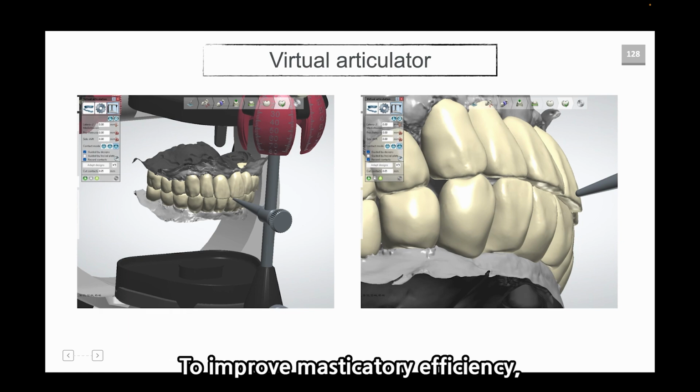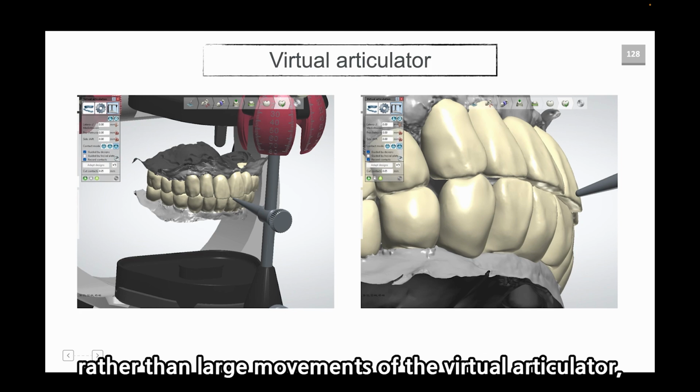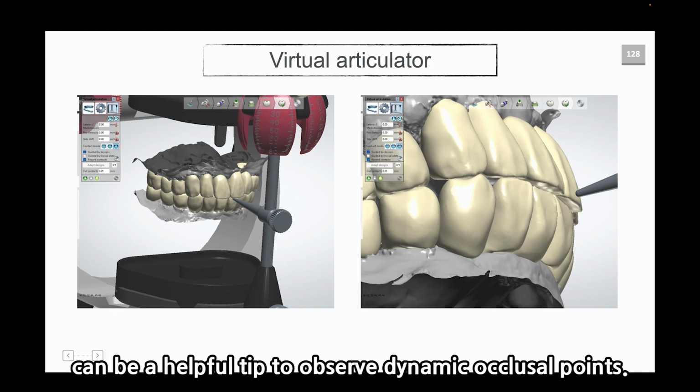To improve masticatory efficiency, focusing on small movements, especially side shift rather than large movement of the virtual articulator, can be a helpful tip to observe the dynamic occlusal point.